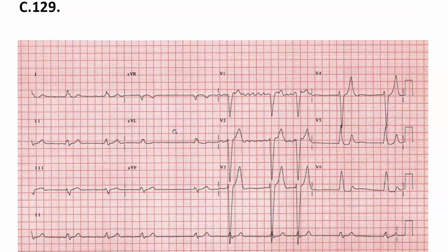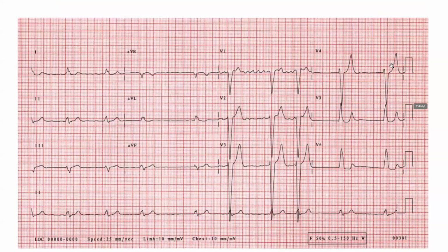Okay, all right. I think Maria is the next one. I know by heart. Yes. Okay, so first we look at whether it has a sinus rhythm. No, rhythmicity. Let me see.